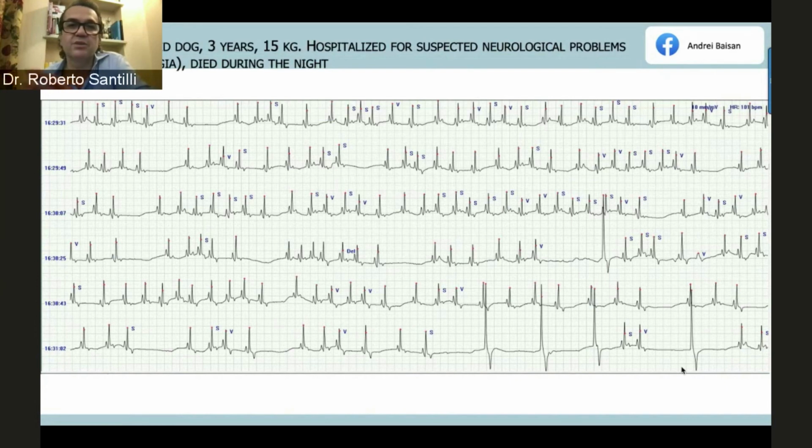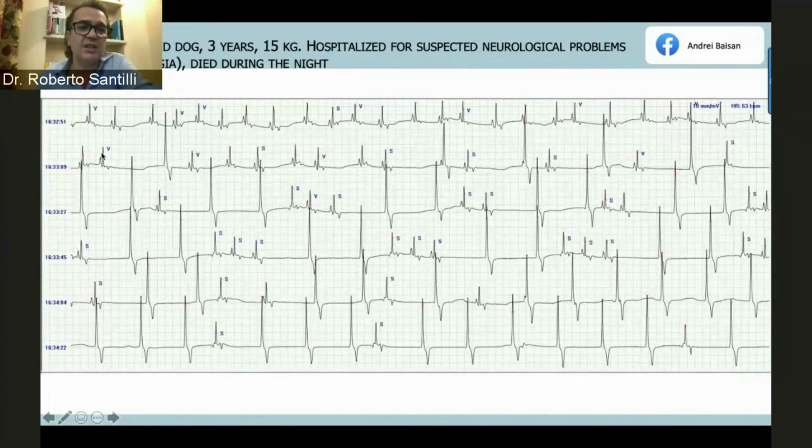I don't know why it was, maybe he can tell us if he also has central symptoms. And then you see suddenly the vagus is actually taking control, and you have mainly a very low ventricular rate. This is usually a precursor of what we call electromechanical dissociation, that is actually pulseless electrical activity, and this is usually the end stage for some of the cases that we have.